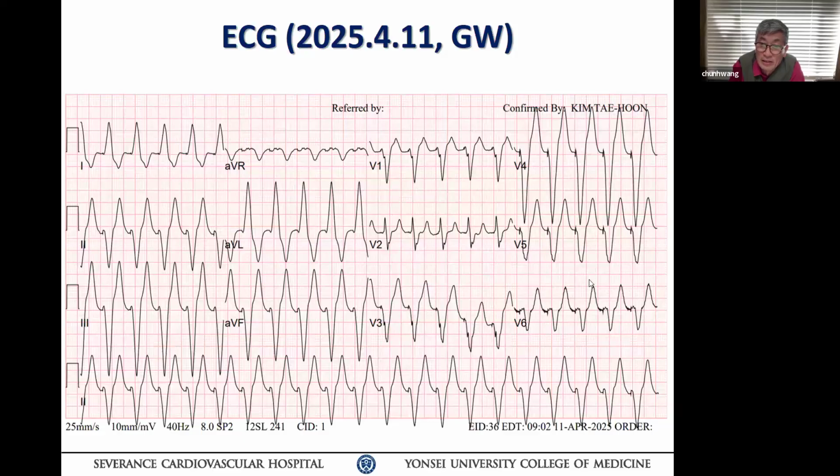So what's the reason that the QRS complex changes in morphology in a pacemaker rhythm, especially pacing from the same site, I assume? You have to have something else going on in there. Otherwise, your R wave cannot change because this is the absolute refractory period. For you to have a PMT, if assuming that's retrograde P, that's too early. The pacemaker cannot physiologically sense that P. Make sense?